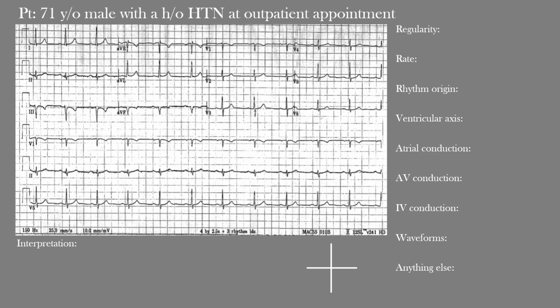This week's case is a 71-year-old male with a history of hypertension that comes to see you at your outpatient clinic. His EKG is shown here.